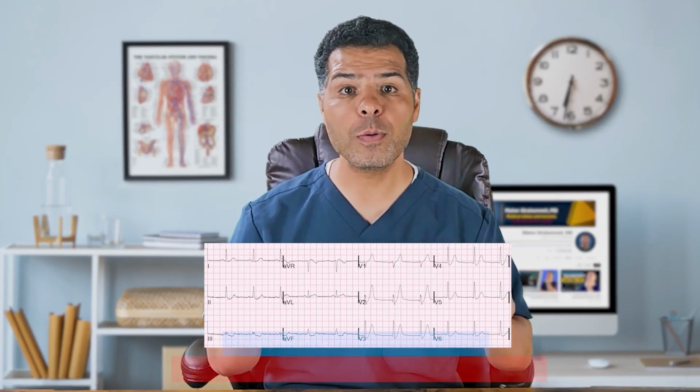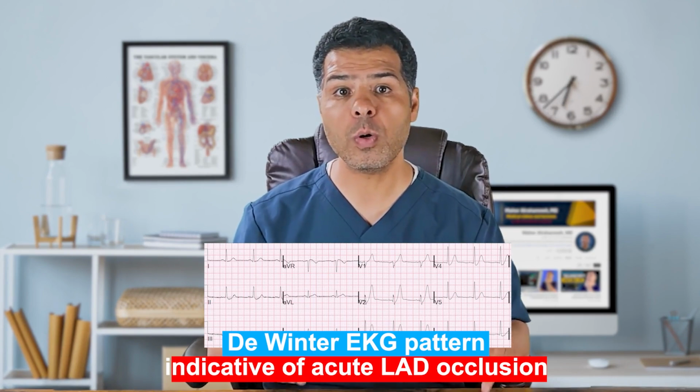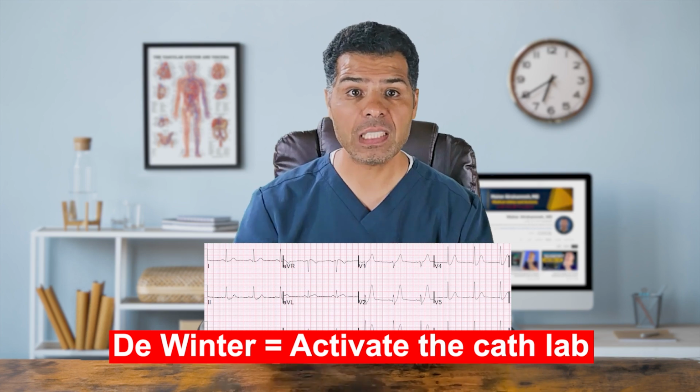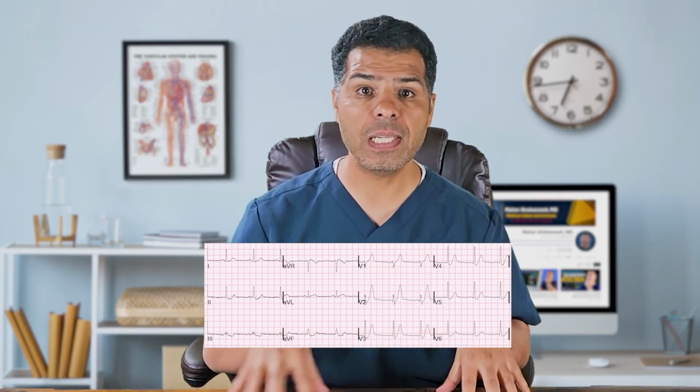This is what we call the De Winter EKG pattern that's indicative of acute LAD occlusion or near occlusion. We must recognize the De Winter pattern and activate the cath lab immediately. This patient was found to have 100% LAD occlusion.